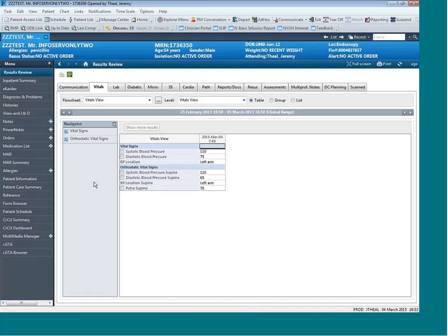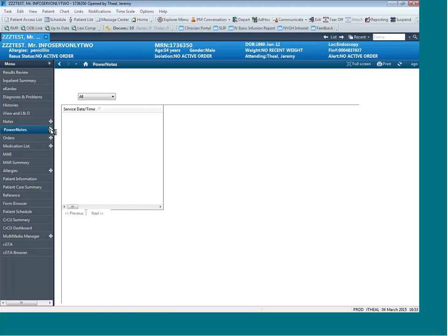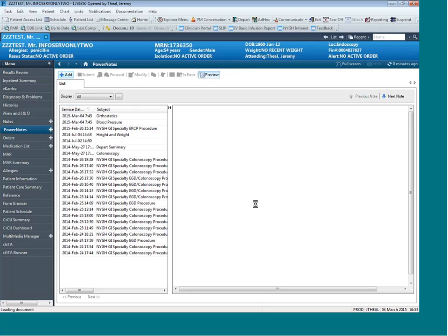What I'm going to take you through here is an example patient. This is a patient who comes to the hospital for a screening or a surveillance colonoscopy, I should say. This is a patient who's 54 who had a previous colon cancer resected 3 years ago and is coming back now for a surveillance colonoscopy to ensure that there has been no recurrence of polyps or other lesions. So I'm the endoscopy physician today, and I'm going to open an endoscopy note.